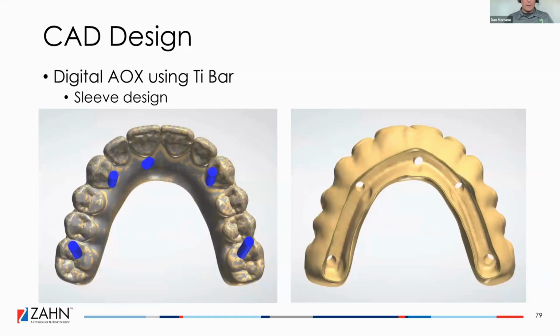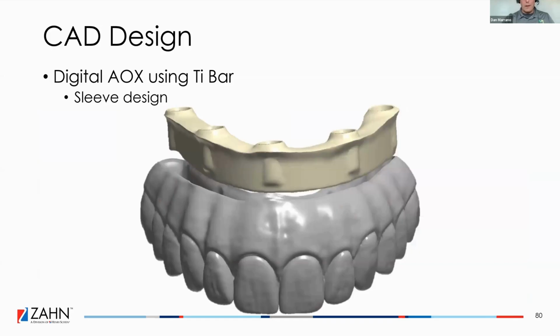Turn on the design that has the holes in it, and that's how I get the orientation for my access holes. That's where I know where to put my access holes, is with my original design that I maybe sent to the doctor. And then it cut the bar out.